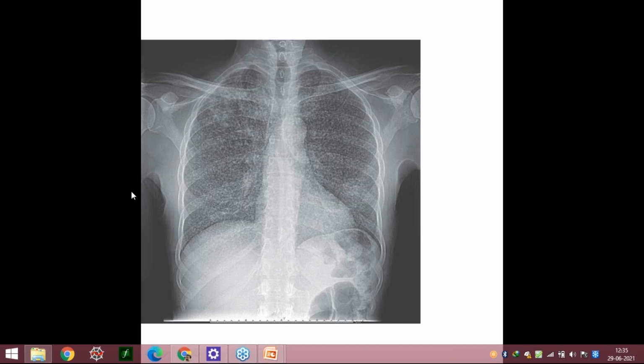Okay, what you're saying, bilateral patchy consolidation, most likely METs. Bilateral patchy consolidation is fine. Airway looks okay. Stippled appearance on lung field. Miliary TB, good. Multiple small calcification throughout the lung. Patchy opacity, bilateral. Miliary TB, yes. So here what we are seeing, airway is fine.